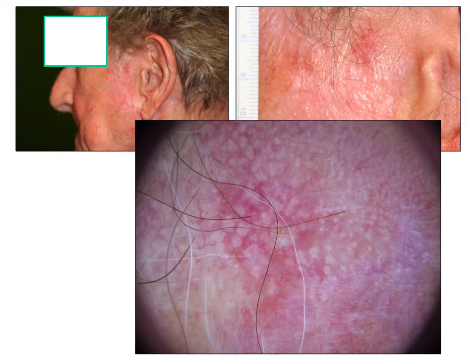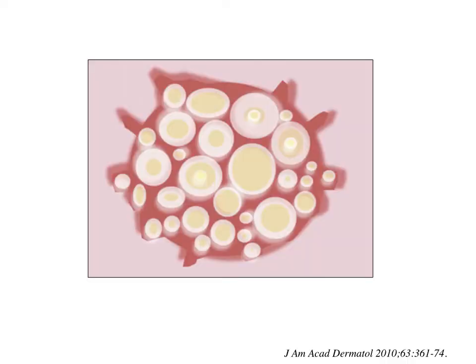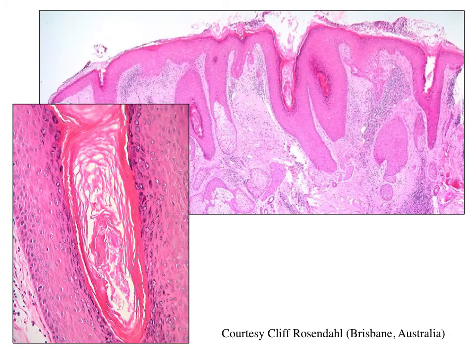But again, the clinical vision is often more powerful than the dermoscopic image because the whole purpose of dermoscopy is to reduce the optical impact of the stratum corneum in the observation of the lesion. So this is a scheme of this fragola, the strawberry aspect.